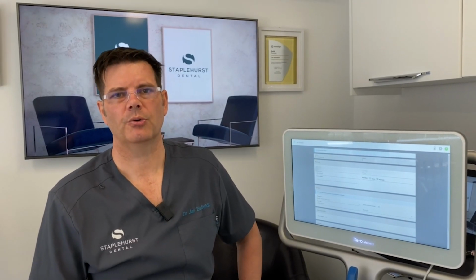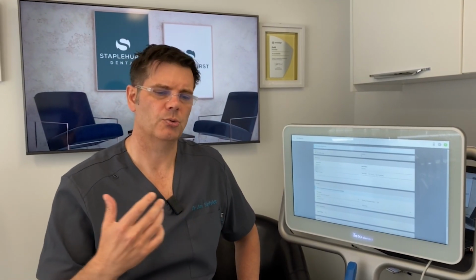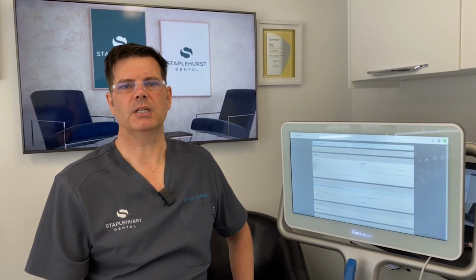Today I want to show you a really cool new feature which is available on the iTero. Do you remember when you are going to do a prep scan and then you write a prescription to your technician? Sometimes you want to actually explain something which can be a bit tricky to do in text. And we now have the ability to add video and photos to our prescription.